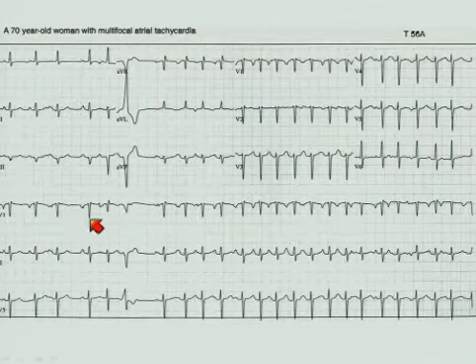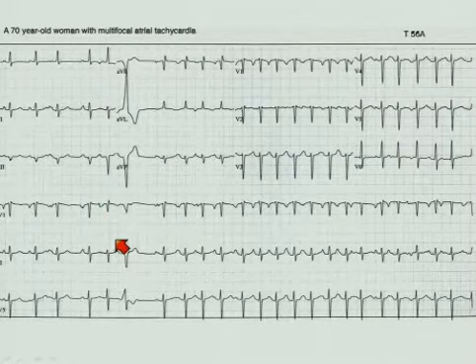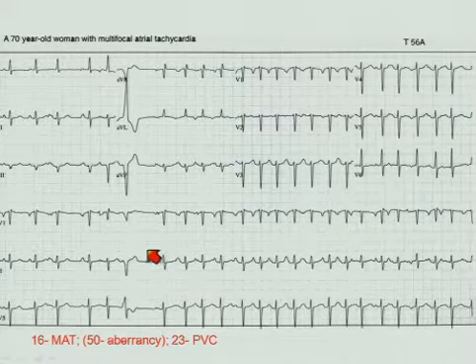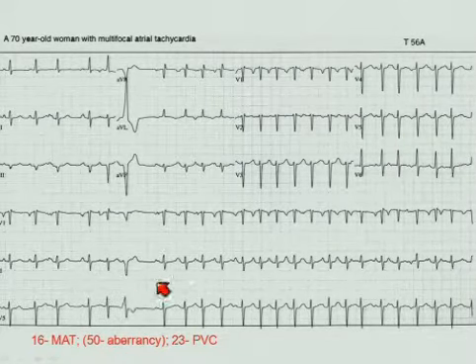See the long pause, short, preceded by a P wave, so it's not a PVC, and the right bundle, that's an Ashman beat. Good, thank you. Multifocal atrial tachycardia, Ashman aberrancy, and PVC. If I were taking the test, I'd put all 3 of those. If I were scoring the test, I'd give you full credit for the multifocal atrial tachycardia.